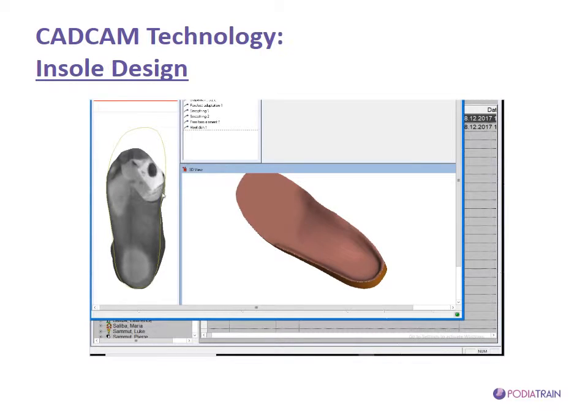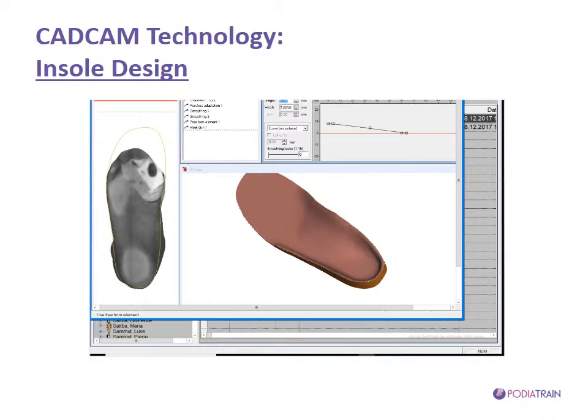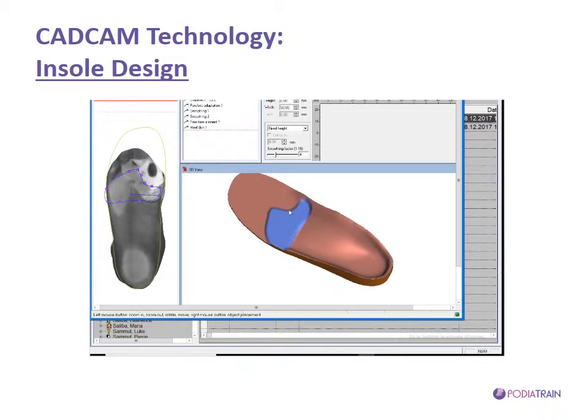It is what we call a single wing plantar cover, and to do this I use a device called a freeform element, and this freeform element will allow me to design any type of padding design. So as we can see, the shape of the single wing plantar cover is going to leave our area of interest, which is the ulcer, approximately here.